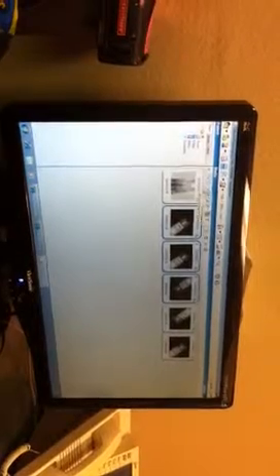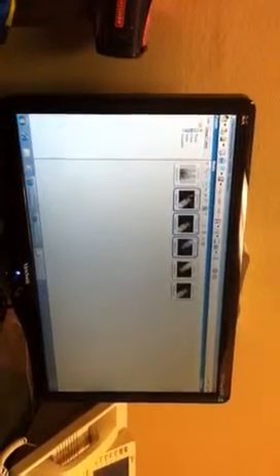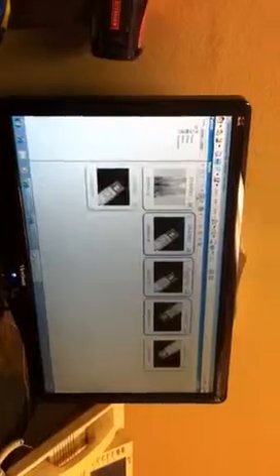The default is medium. As you get more X-rays, instead of having to scroll through them, you can go to small and see all of them. Or if you've just got a few and you want to see them nice and big. And if you're still not satisfied with all of that, you've got the custom size. We're all about choices. Now, does it reset after every patient you open? That's correct. The default will be this. This is what the system default is. But the others you can do on an as-needed basis.